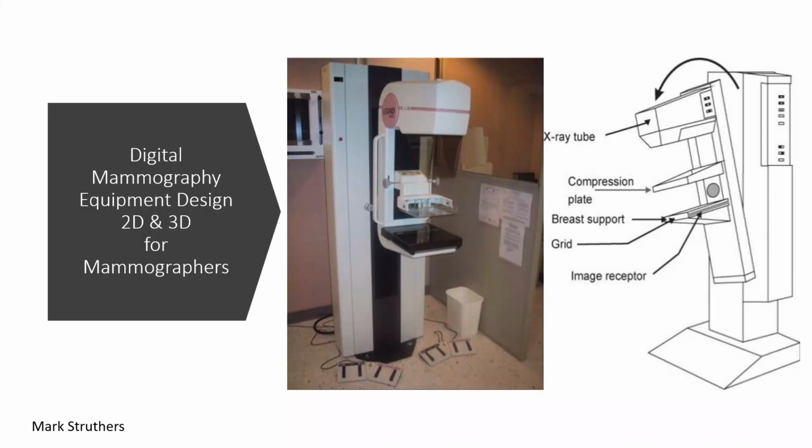Here we have both a picture of a dedicated mammographic unit and a line drawing. We'll try to use a number of visuals to demonstrate the material contained in the presentation.